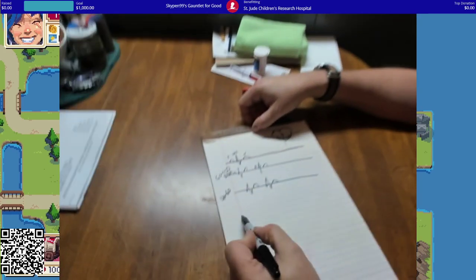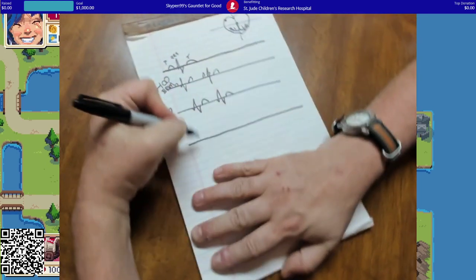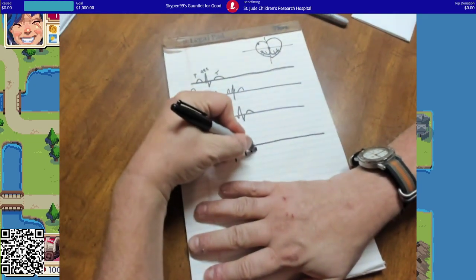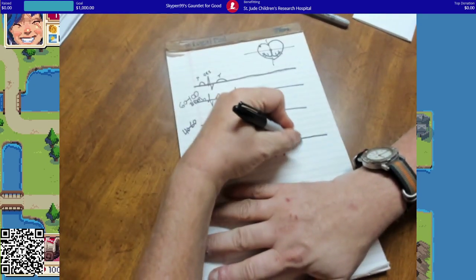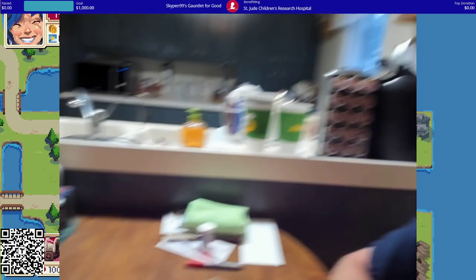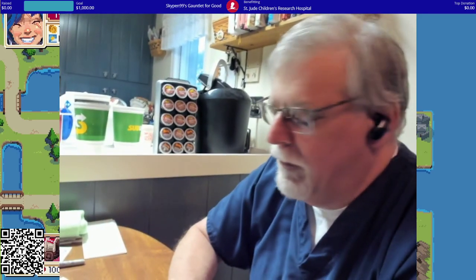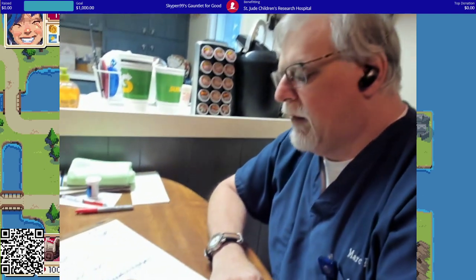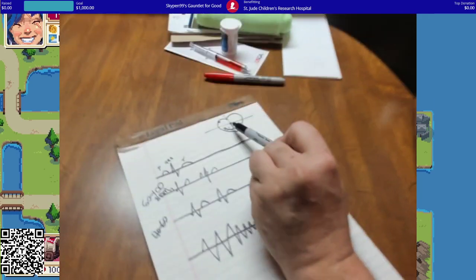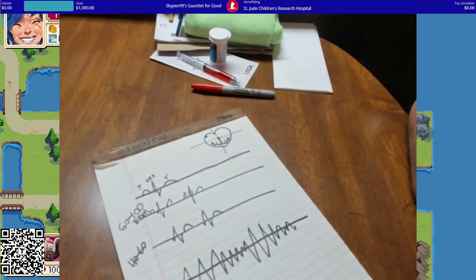So let's look at everybody's favorite on the TV. We're looking at all these crazy ones. Everyone has seen this on television, I'm sure. It's a ventricular rhythm. It is not necessarily a healthy rhythm. It is a lethal arrhythmia. So what are we actually seeing when you see this? There are spots in the bottom that are starting the beat, not going through the normal conduction system.